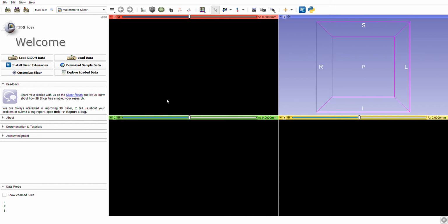Segmentation is nothing but separating a particular part from the X-ray or the MRI scan, whatever you have with you. So we will start with the experiment, the practical. Now, into this practical, the software that we are using is 3D Slicer.